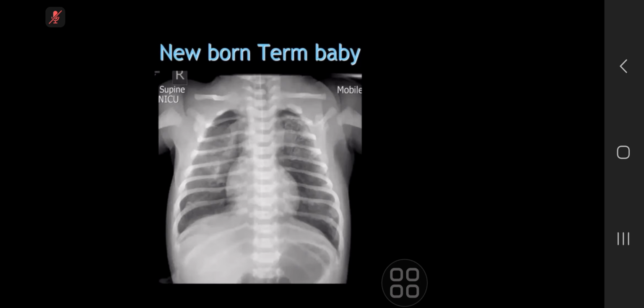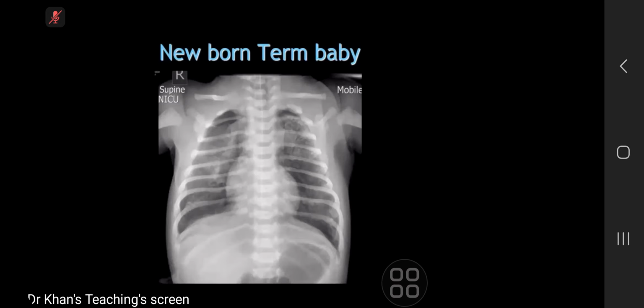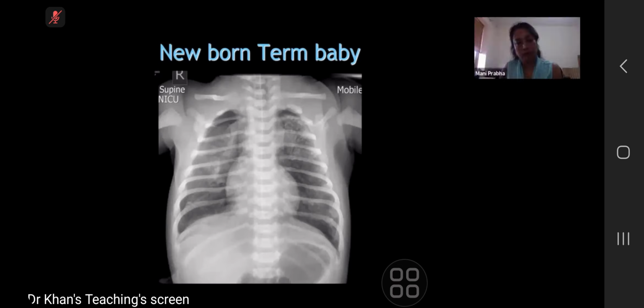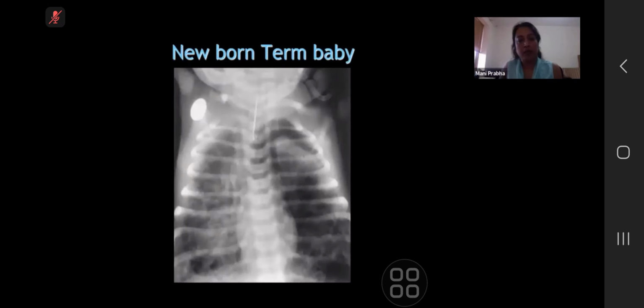So meconium aspiration syndrome tends to be associated with traumatic births. So often there's a history of meconium-stained liquor, and then the baby breathes in parts of meconium that it's passed due to fetal distress, and this meconium is sticky and it causes blockages in the small airways, and sometimes you get valve type effects with distal overinflation and air leaks, which is why perhaps we have the pneumothoraces here. And then also atelectasis and alveolar blockage, which is where the opacities would be coming from. Yeah, super. Very well described.